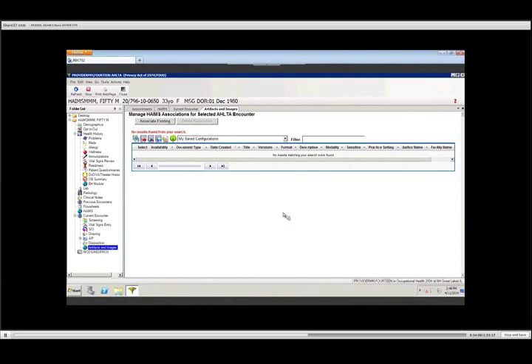Anyone with the HAIMS clinical role has the ability to paperclip an asset to an encounter. But it also means that anyone can undo the paperclip or delete it or remove it. Remember, nothing is ever deleted. It's just removed, unpaperclipped. Does that make sense?